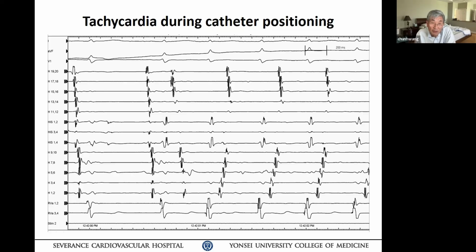So this is a typical example. What happened here? You had a premature beat, sinus followed the premature beat, there was a long jump, and then you have at RV34 a small sharp potential. You see that? Very tiny. Yes, that's the right bundle activated. And then the tachycardia came back. Which retrograde A is earlier? Tell me. The first beat, you think that's early? Isn't that early? Yeah, it is early.